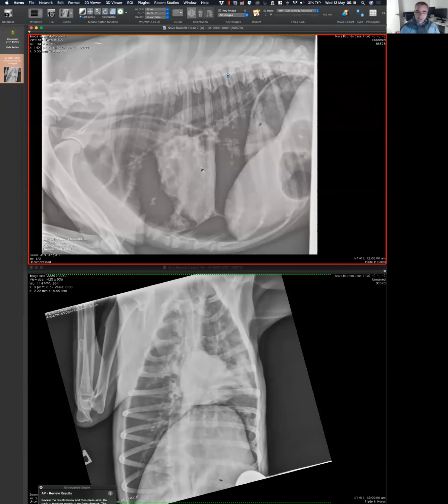Okay, so we clear the heart vessels, we clear where the increased opacity is. Now the thing that I want to come back to is, there seems to be a contradiction. Some of you reported a decreased lung opacity, and some of you reported an increased lung opacity. So what are we gonna do with this contradiction?